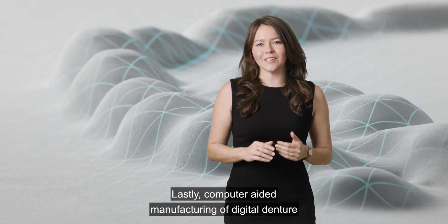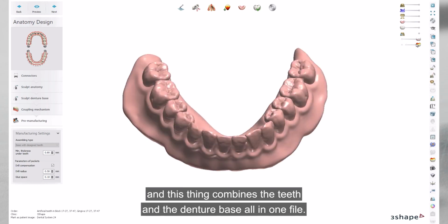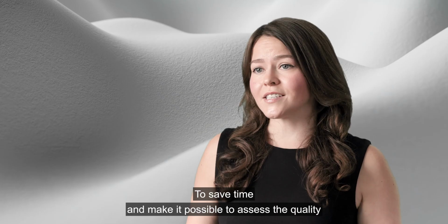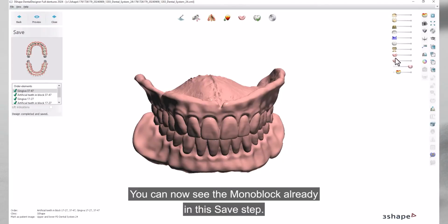Lastly, computer-aided manufacturing of digital denture cases involves quite a few design output files, and one of them is the automatically generated monoblock. And this thing combines the teeth and the denture base all in one file. To save time and make it possible to assess the quality of the assembled monoblock before closing the case, you can now see the monoblock already in the save step.